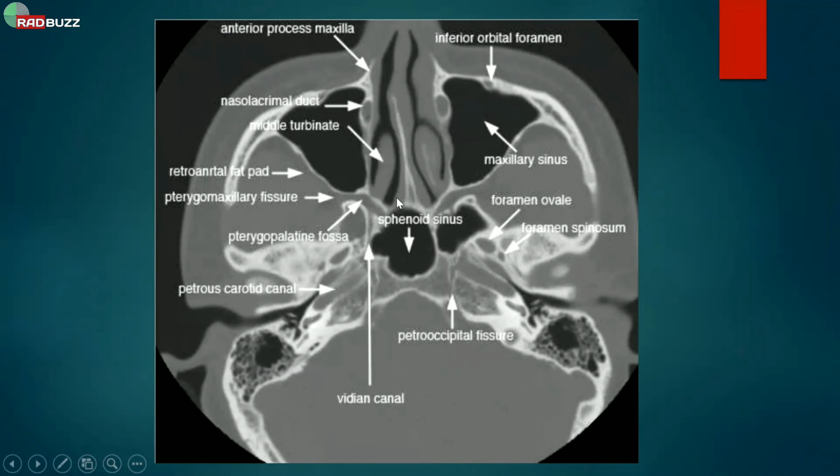Nasal bone is there, but basically that one is going away. Nasolacrimal duct pairs on both sides. It's a symmetrical opening here, and we can see the maxillary sinuses more clearly, and the pterygopalatine fossa. So basically it's just the back and base of the orbit and the maxillary sinus. Sphenoid sinuses lie medial to this aspect.